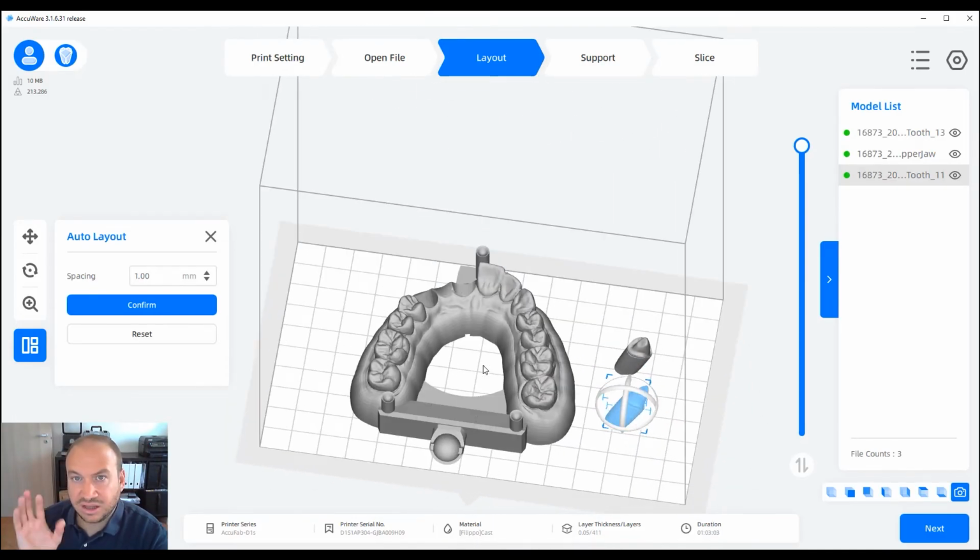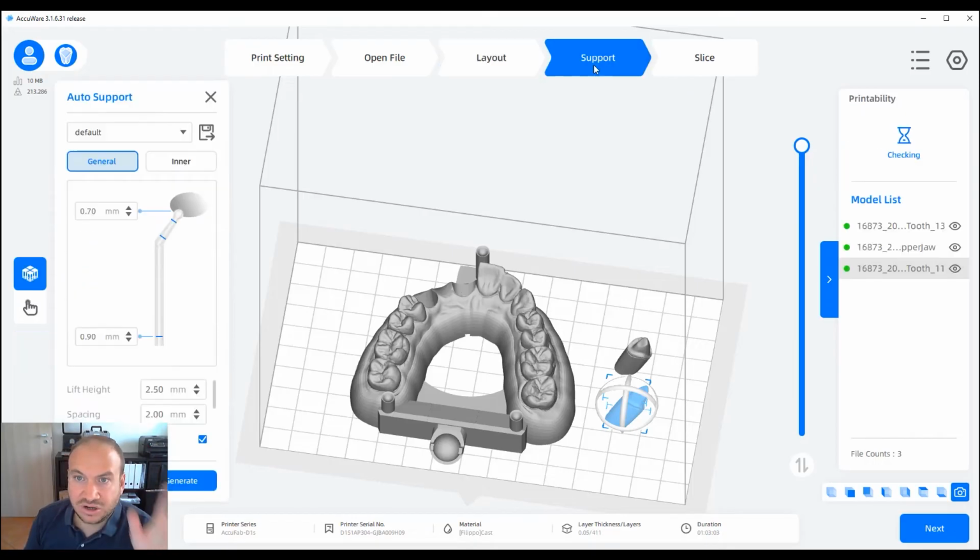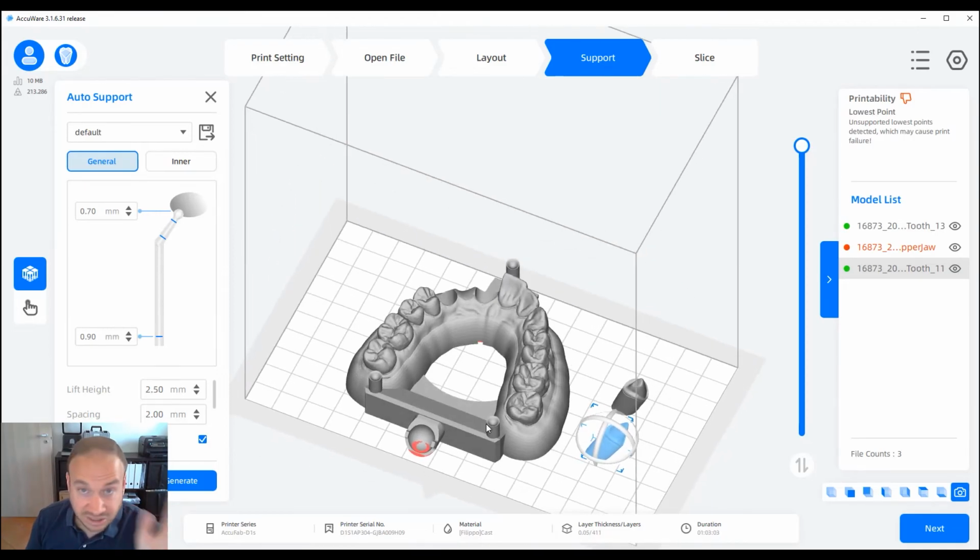As I said, every time you print, except for the accuracy calibration file, it's really important to add the support, because the base is always overexposed. So please don't take measurements in the first layers, because the first layer is always overexposed, to be sure that the layers stick perfectly to the platform. For that reason, the initial layers and the enhanced layers are always overexposed, and it's okay.